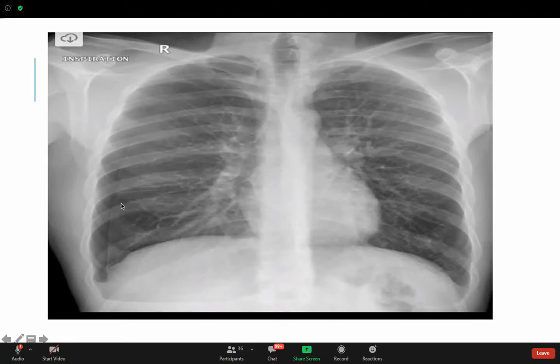Okay, so actually the lung here is collapsed, and the pneumothorax extends from the top all the way to the bottom of the lung. So this is actually a massive, a large pneumothorax. It can definitely lead to tension pneumothorax. Is this clear? You guys see this line? I showed you the line here.